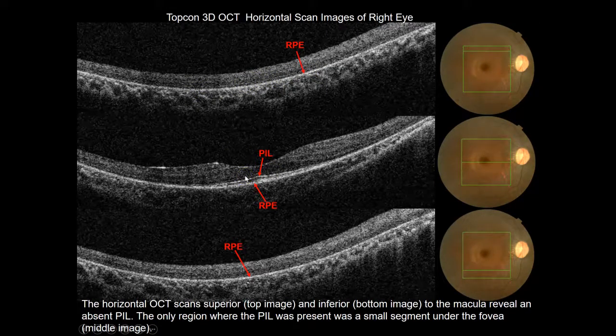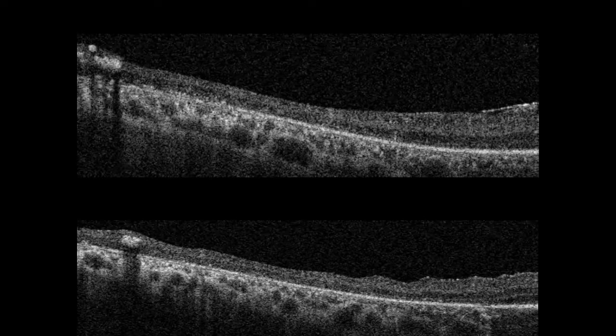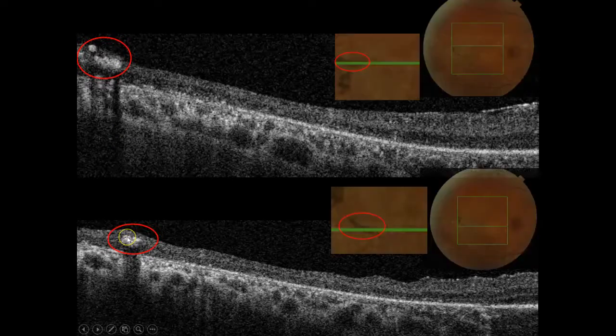So, an ERG will confirm that this patient has a reduced function of the retina to confirm the diagnosis of retinitis pigmentosa. But OCT alone, or OCT in combination with autofluorescence, is usually very, very useful to make the diagnosis. Here we're actually looking at some pigment that's migrated from the retinal pigment epithelium to the large retinal vessels, which shows up on OCT. So you can use the OCT to do lots of different things.